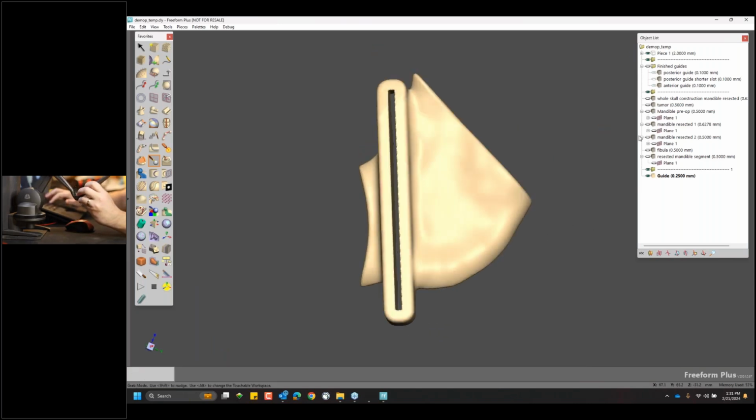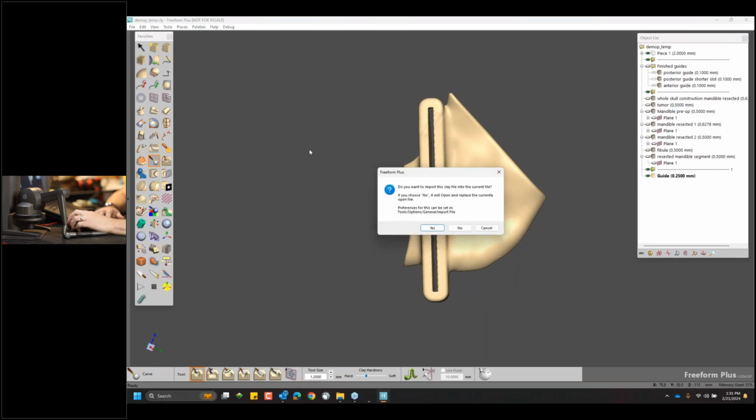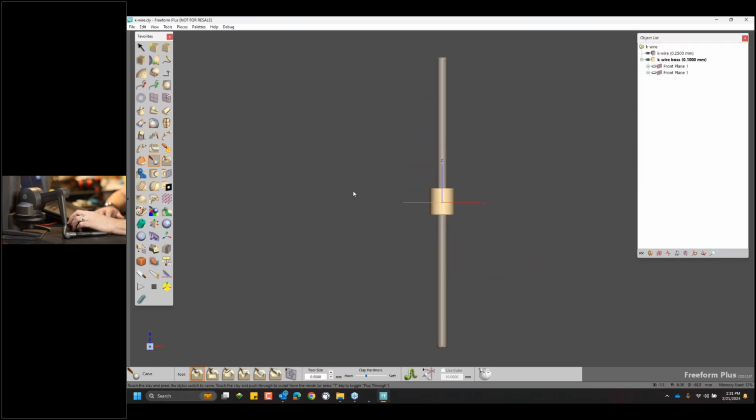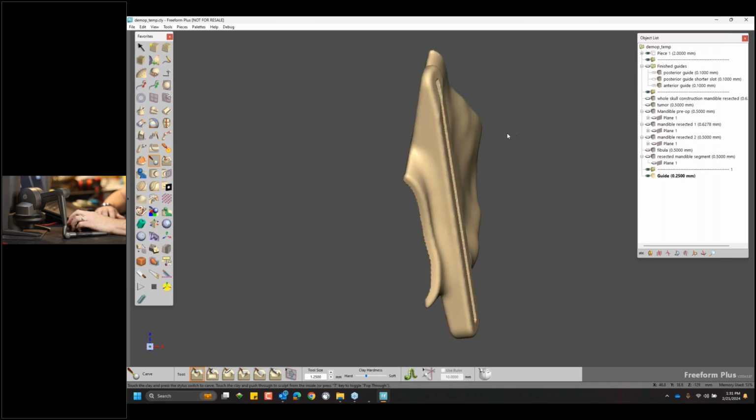So from here, I wanted to add a K-wire boss, so I can click and drag from outside, import this. Oh, nope. I picked the wrong button because I chose to open that file instead of import.